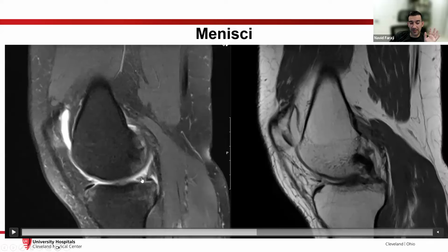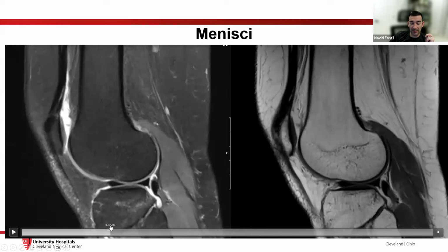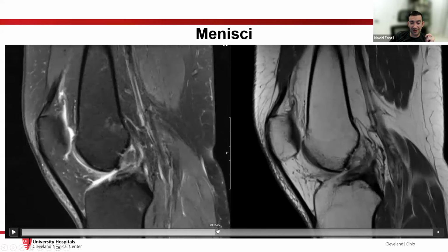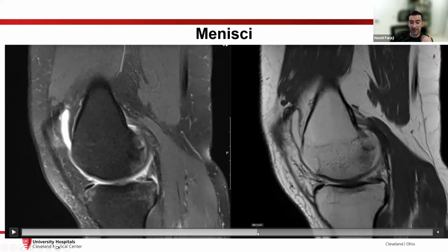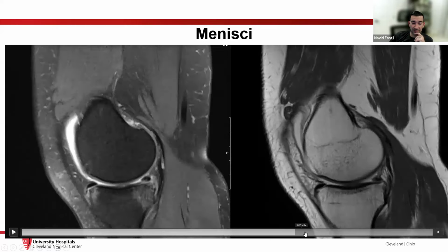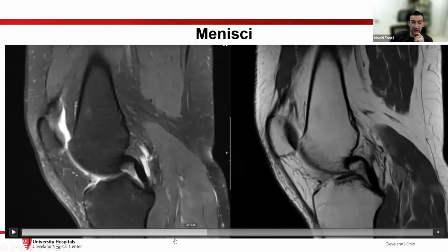All we see is this mashed potatoes, terrible gray looking ghost of a triangle. We don't see a nice robust triangular structure like we do, for example, with the lateral meniscus. So first slice out of your PCL, if you don't see a medial meniscus posterior root, that indicates a radial root tear, which can cause instability of the meniscus. It extrudes into the medial femorotibial recess, and you're going to have premature or accelerated articular cartilage loss in these patients, and they're going to have symptoms of locking and all the classic symptoms, as you know.